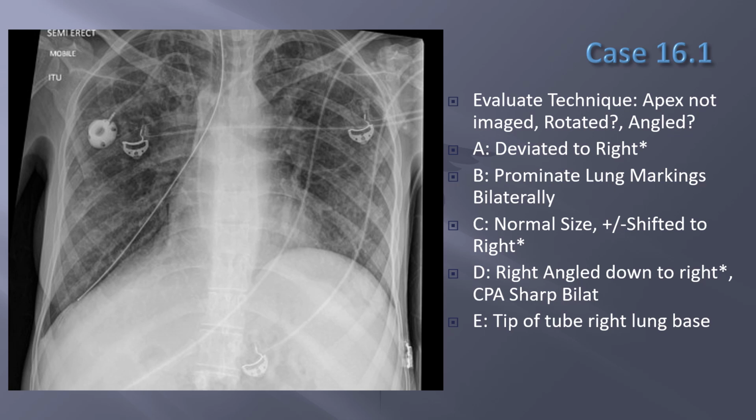If this patient was awake or kind of semi-awake and has a cough reflex, if you start inserting this down their nare like a nasogastric tube, and it actually goes between their cords into their trachea, you'll probably elicit a cough reflex, and the patient will start coughing, and as you insert it more and more, the patient's coughing more and more. They really shouldn't cough with a gastric tube insertion. Sometimes they may gag a little bit because it's going to the back of the throat, but once you get into the esophagus, that all kind of stops, and they shouldn't really be coughing. So if they're coughing, you're in the lungs.